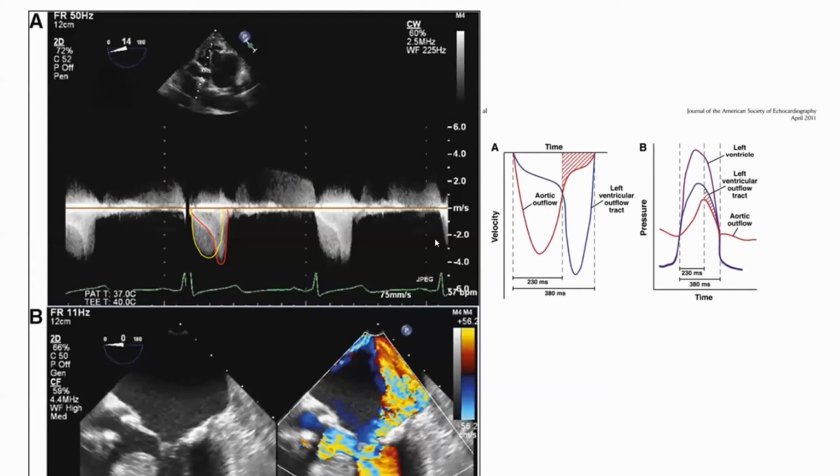So you can see here, this is a combined case of aortic stenosis and LVOT obstruction. But assuming that is the aortic profile, measuring that and calculating its mean gradient is not going to be accurate, because if this is the total ejection time, what happens is the aortic velocity starts to truncate very early on as the outflow tract velocity and gradient increases, so it actually stunts it.